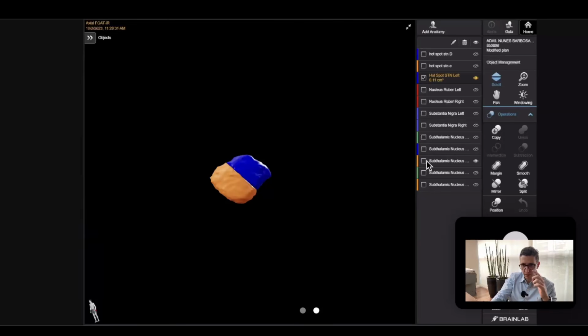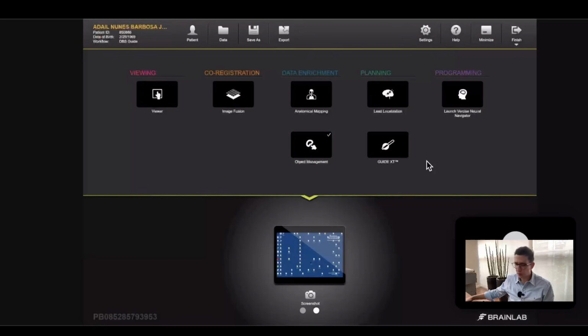Behind my screen, my video here, and then you click in the next, and you have already prepared this. And once you do that, you are going to find the electrode. I'm not going to show you this because that's not the goal of this class. And once you do that, you are going to save as, for example, then you save as Illumina 3D, for example, the file, the folder.